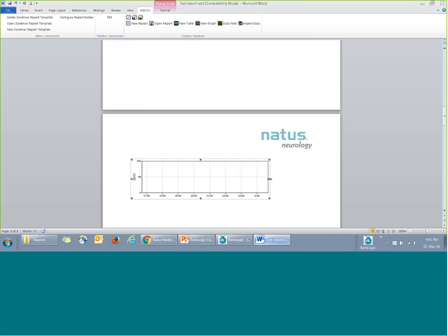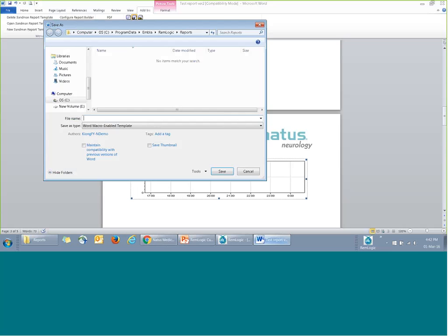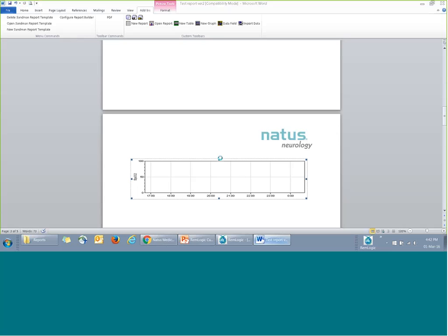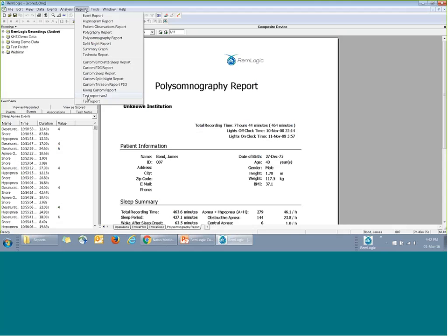Just be careful when it comes to graphs. Just be careful when you adjust the sizes. Sometimes you may not get the equal size that you wanted. Okay, let's save this again. Okay, let's generate again.